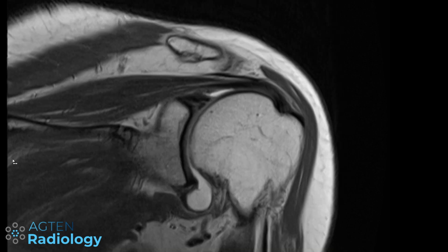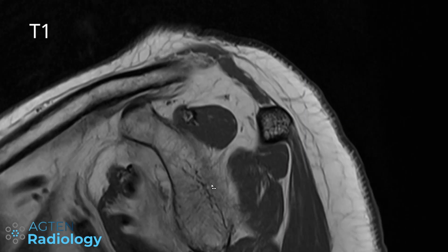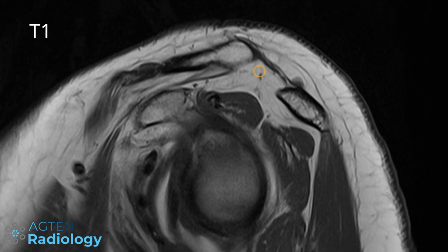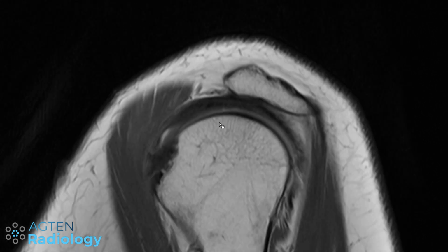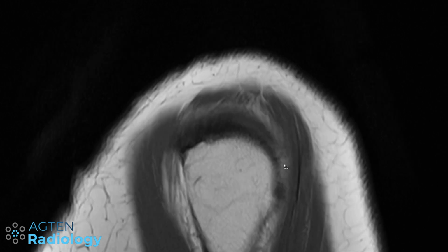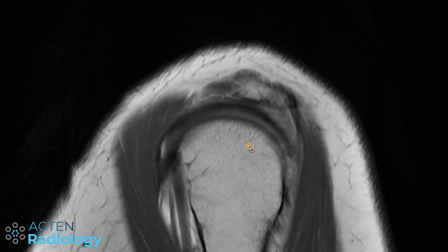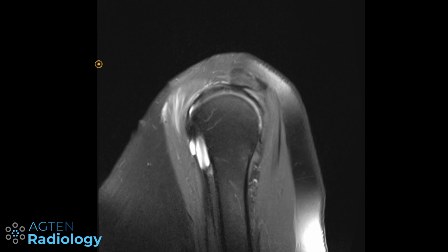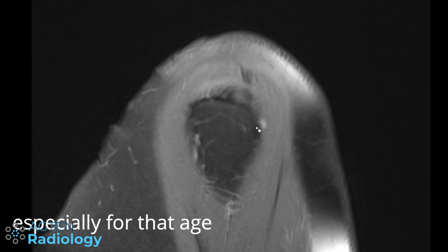I can also show you a T1 here on a sagittal. And in case you're wondering why I didn't show you T1 weighted images beforehand, it's because not all of these exams had a T1 included in their protocol. So we can see we have the tendon here quite normal, no abnormal signal intensity. So I would just say, even in a 70-year-old patient in this case, that we have a normal tendon without tendinopathy.